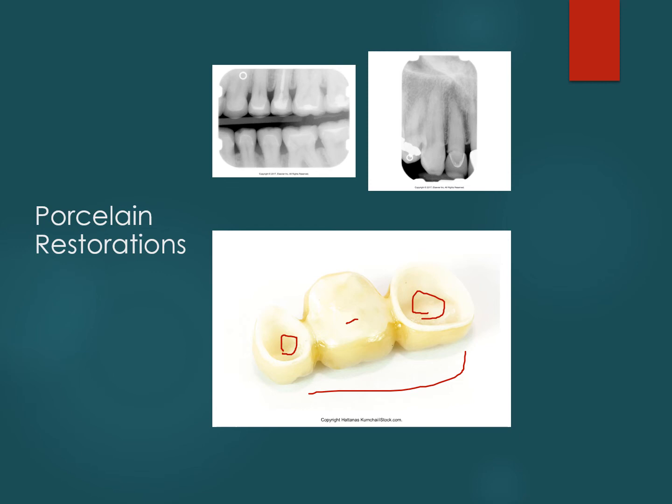And then at the top here, these are all fully porcelain crowns, because we can see there's not a lot of bright white, right? But then there's this perfect little white line right underneath the tooth, which is the cement. I just have to draw another pupil. There we go. And the cement is what is holding this porcelain crown to the prepped tooth. We see that a little bit better right here. You can see that perfect porcelain material, which is pretty much the same density as the dentin, and then it has this cement line underneath holding it onto the tooth.